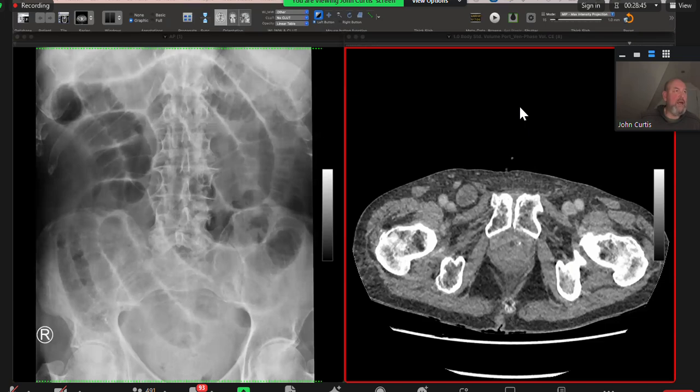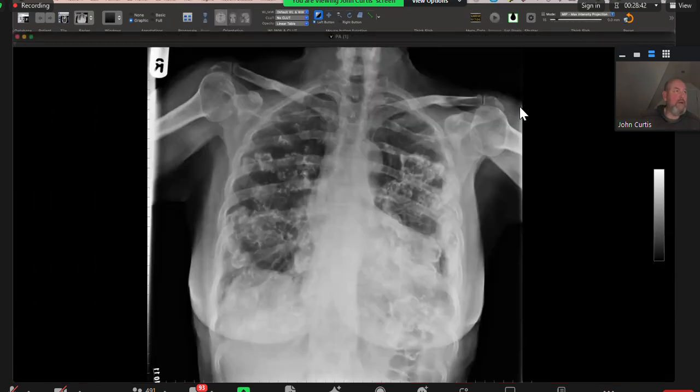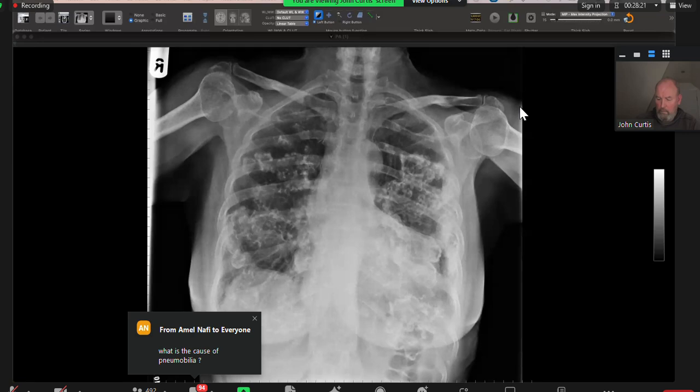Okay, this is a middle-aged female who has a routine chest X-ray after visiting her GP with a cough. I have been presented with a frontal chest radiograph for an adult female patient with a history of cough on routine GP visit. The most obvious abnormality that I can see is lesions overlying both lung shadows.